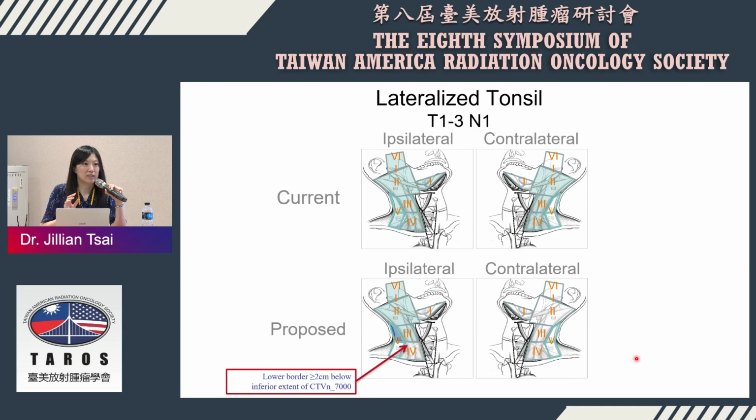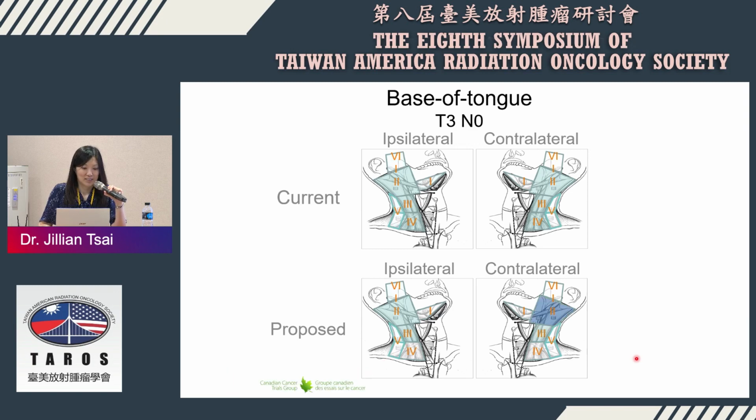And level 2. Level 2. And oropharyngeal cancer. So in your protocol is 70 gray for positive node and only 30 gray for negative node. So how about the equivocal lymph node in image? Oh, the equivocal ones, sometimes we do a 50 gray. But yeah, so it will depend.